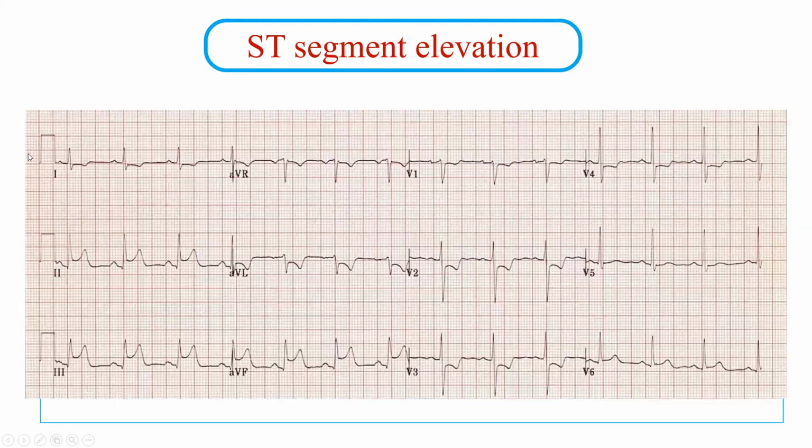Let's have an EKG here and look at it. If you look at this EKG, I will give you 3 seconds to think about where the ischemia or the ST segment elevation is.